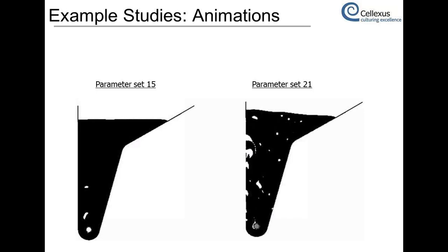So the red region in this graph here, or the shaded red region, shows the target area of where we wanted the bioreactor's bubble size in terms of equivalent circular diameter and aspect ratio to be within. And that's what we ended up doing. We ended up building the finite element model and parameterized a number of items.